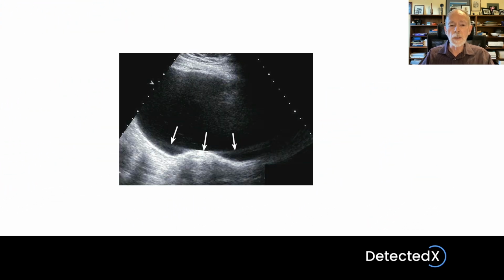Here's an example, an image taken through a filled liquid bladder, and you can see that we have a bright echo coming from a strong reflection in the centre, indicated by the central arrow, and then to the left and right of that we have wispy echoes at the exact same depth. So these are side lobe artifacts. The hallmark of side lobe artifacts is that you have relatively weak echoes to the left and right of a strong reflector, and these echoes are at the exact same depth as that reflector.